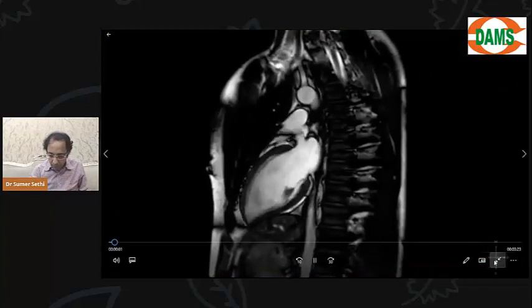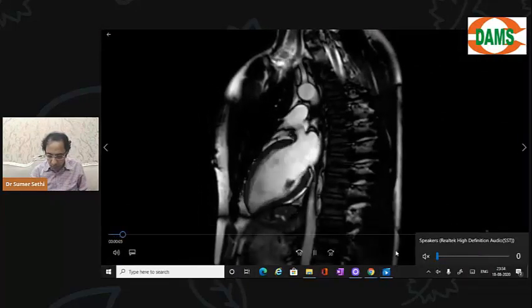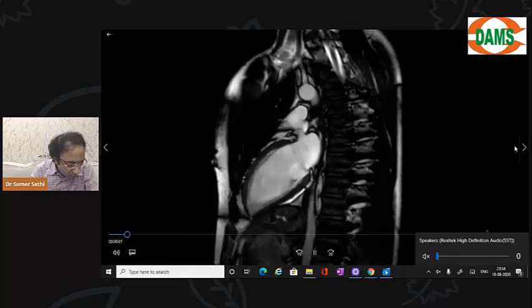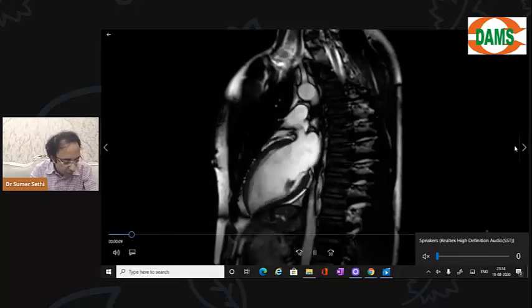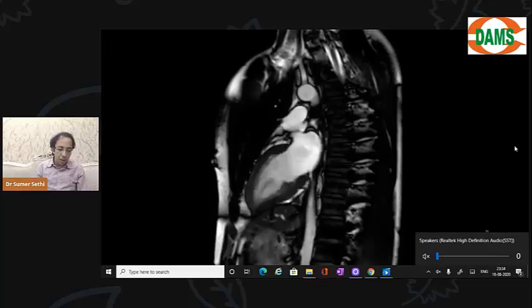Okay, let me show you how a cardiac MRI looks like. Now this is different from a brain. In brain we talked about diffusion weighted MRI, है ना. Heart में तो वो catheter angiogram वगैरह करेंगे ना. So this is how cardiac MRI looks like.